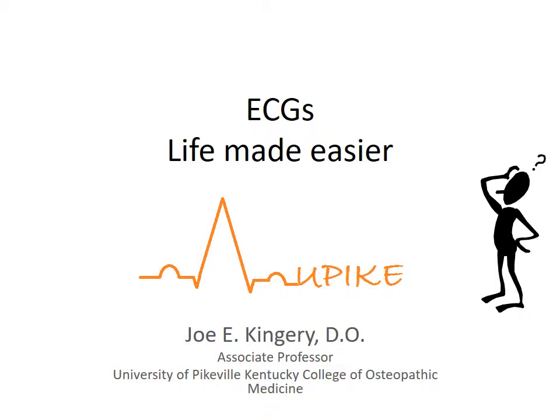All right, let's talk about EKGs. I want to go through this as a version to help with ISAs and with board exam type questions. EKGs can quickly become overwhelming and complex. Let's not go there. Let's keep this as simple as possible as we go through it, okay?